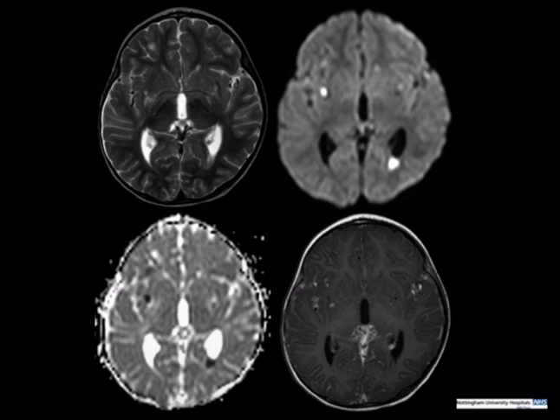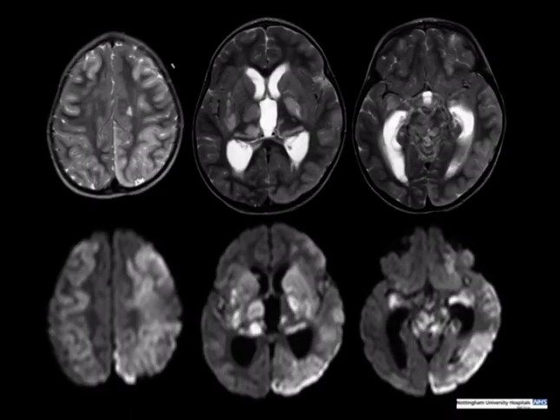A bit like the subdural collections, these don't have to restrict, so you can have turbid material that just settles out in the occipital horns without restriction. It's a very aggressive disease, particularly pneumococcal meningitis, and you can see this is the follow-up scan where there's been progressive ischemic damage despite treatment. The pattern is perforator ischemia, so lots and lots of basal ganglia and thalamic changes. You can see all of these ischemic lesions in the midbrain, and worsening appearances of the ventricles.